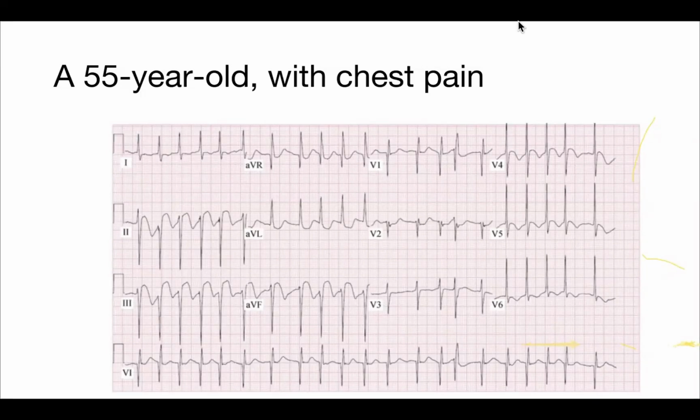If there are ischemic changes, that is a separate diagnosis, right? Here you can see ST elevation in 2, 3, aVF and reciprocal ST depressions. So maybe this MI has caused the atrial fibrillation on presentation. At that time, you don't just treat the atrial fibrillation. You have to treat the MI. It goes hand in hand.